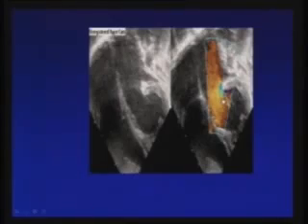In the AV discordance condition, the left-sided valve, which is the tricuspid valve, is usually dysplastic, in 90% of the cases in the autopsy series. Functionally abnormal around 50 to 60%. So here you are seeing the TR, tricuspid regurgitation, which is now left-sided. So it is an echo of the corrected AV discordance.